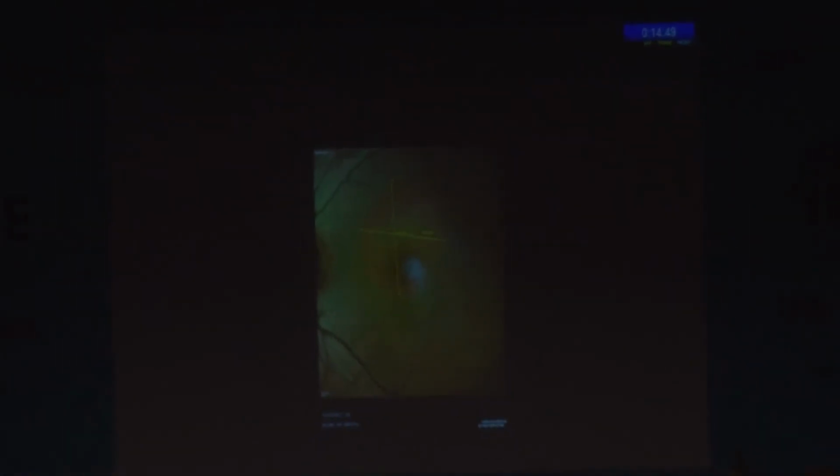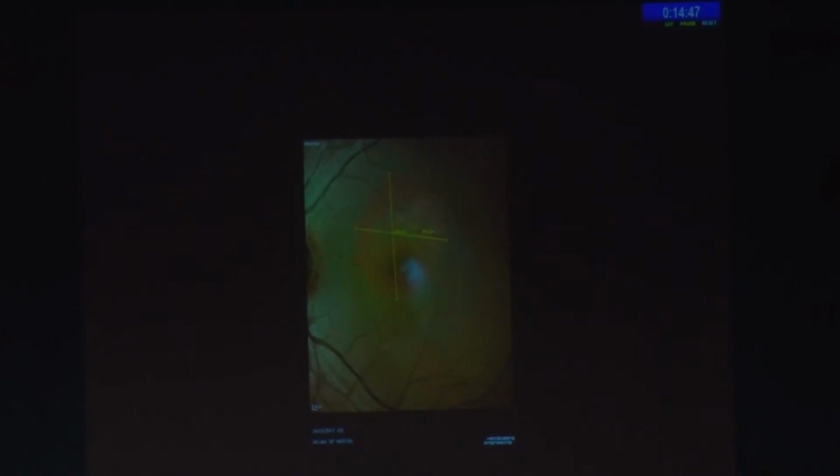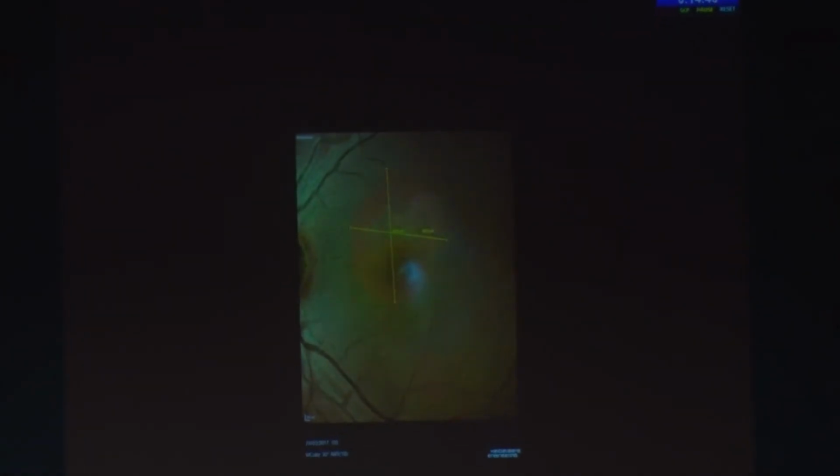So first we'll start with Dr. Anand, multimodal, multicolor imaging. So I think based on what Manoj said, this probably could be a Nevis kind of thing. This reddish, there's no edema over that, there's no greenish stuff. Okay. So looks like a well-defined lesion, possibly.